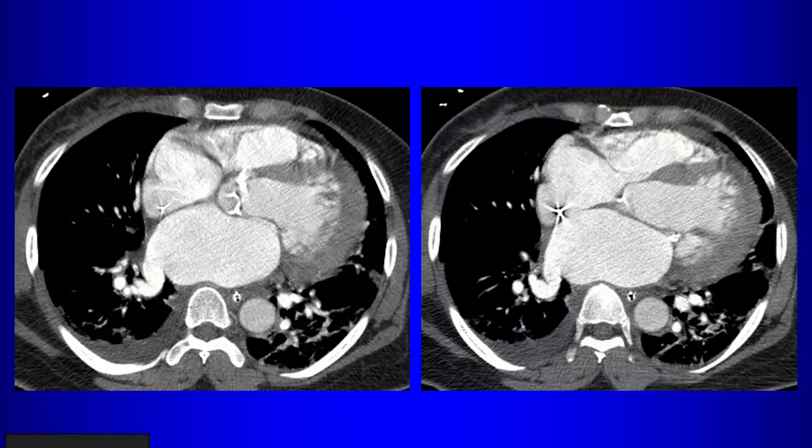And also when we look at the cardiac chambers here, what do we notice? There's dilatation of the left atrium. So you would suspect the patient has rheumatic heart disease, and causing what? Mitral stenosis, right? So you suspect the patient has mitral stenosis. And also with this amount of aortic calcification, you might wonder about aortic valvular stenosis also. So this was a patient with rheumatic heart disease with mitral valve stenosis and aortic valve stenosis, and you can at least suggest the findings on a routine chest CT scan.